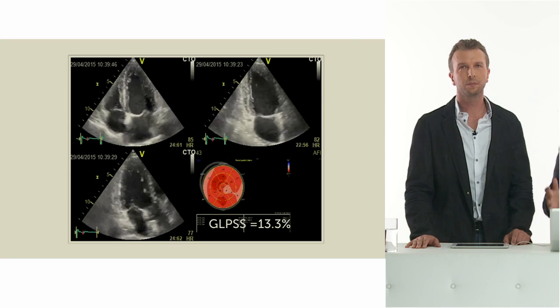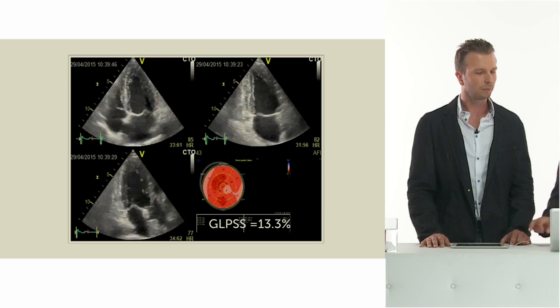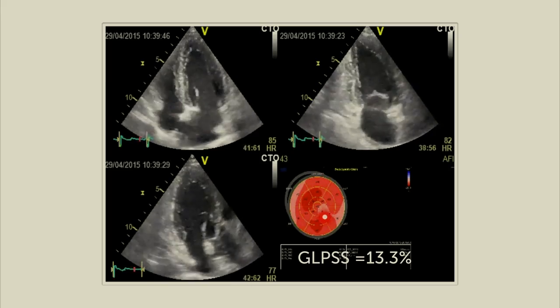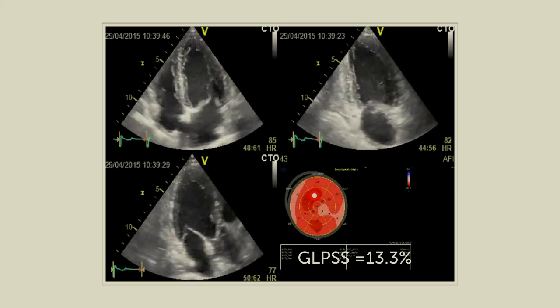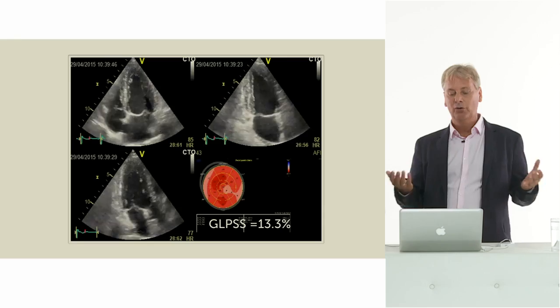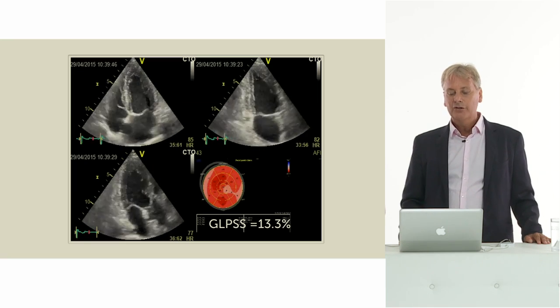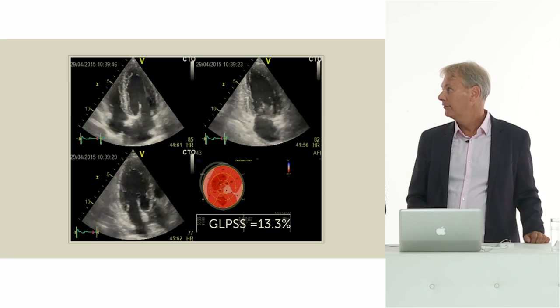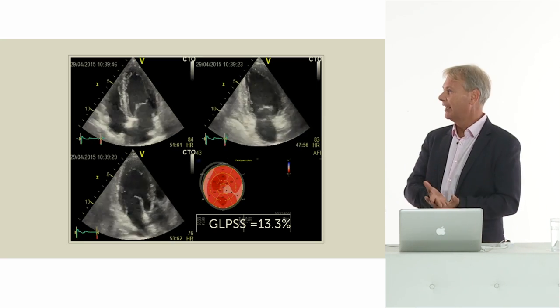We used a Speckle Tracking analysis, and what you can very nicely see is that actually the Speckle Tracking is not normal. You have an inhomogeneous reduction of the global longitudinal peak systolic strain of 13.3. You remember the normal value is somewhere between 17, 18, and that's definitely below. So this means the patient actually has subclinical systolic dysfunction. Yeah. According to the new HFpEF guidelines, this would still be a HFpEF, right?